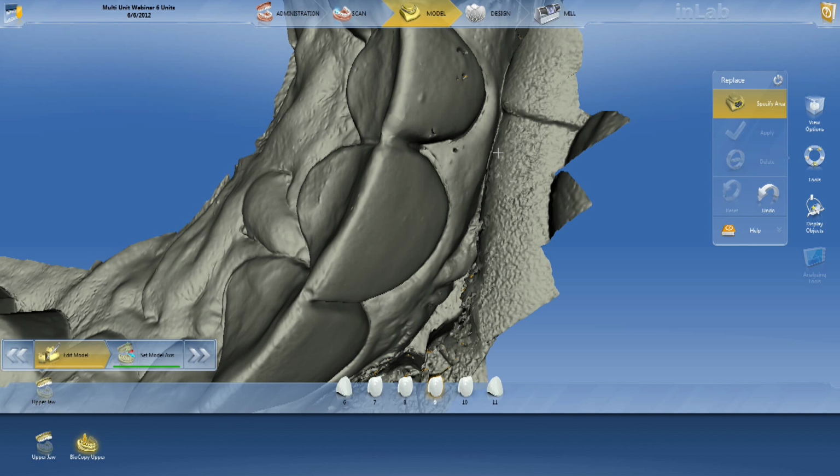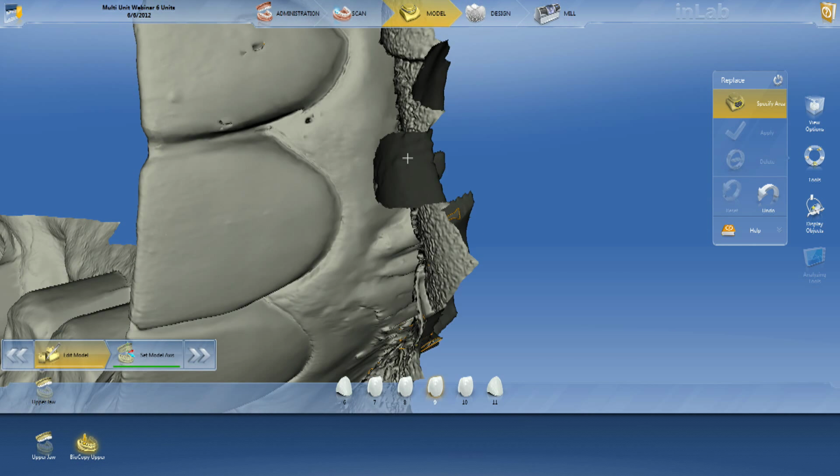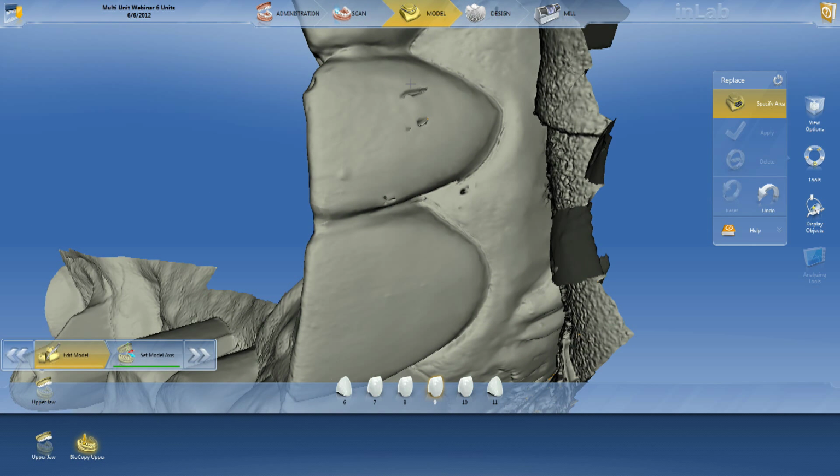See? So now when it proposes, you would not see all these lines. You can actually smooth out the little bumps if you want. You can work on two areas at the same time.